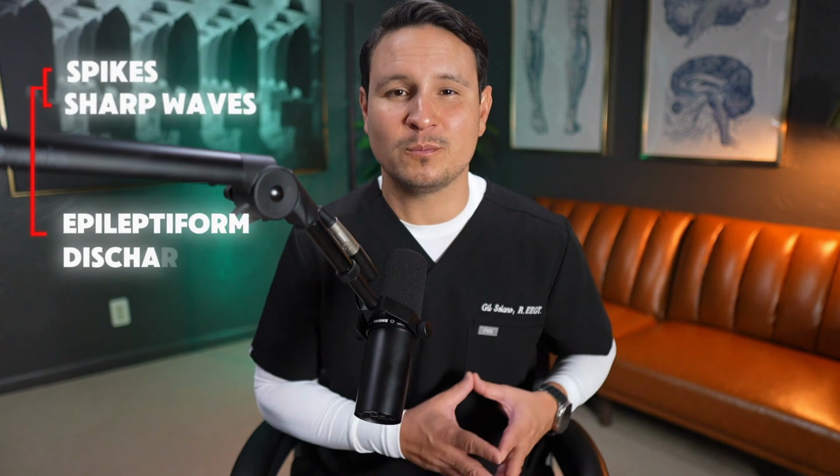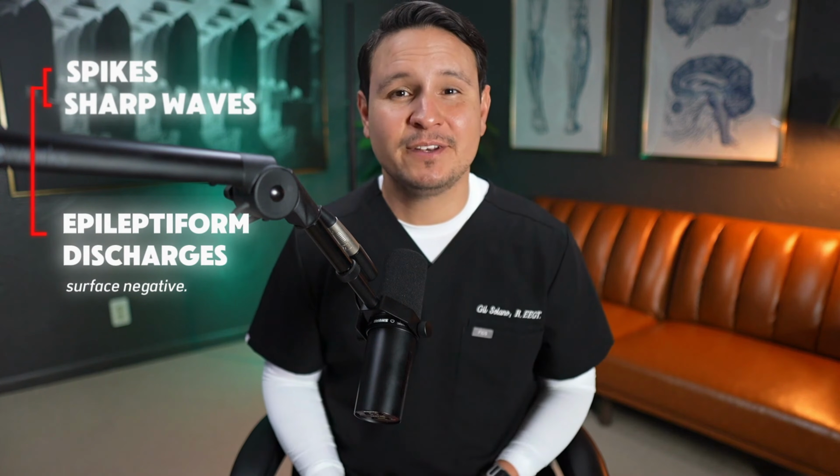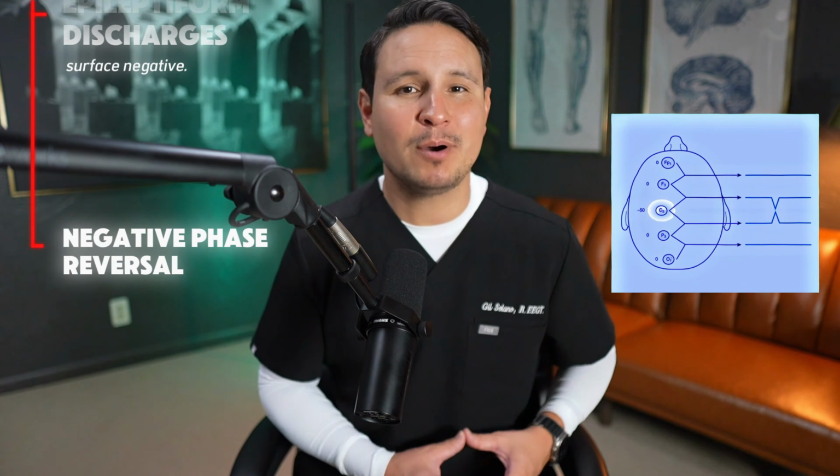In routine clinical practice, spikes and sharp waves, collectively known as epileptiform discharges, are almost always surface negative. This negativity creates the typical negative phase reversal that we observe in a bipolar montage on an EEG. However, there are situations where we might encounter positive spikes, and these cases require special attention.